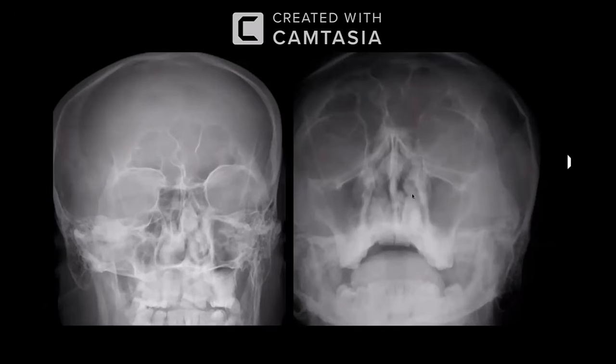Okay. Let me just take over. So first, are you able to appreciate this expansion of the left zygomatic arch? Look at this expansion. Do you think it's normal on the right side?